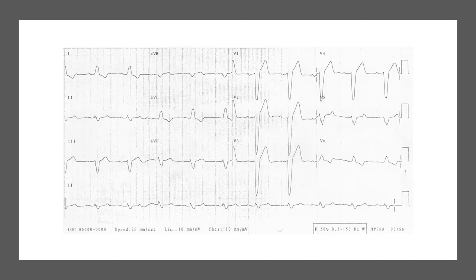Okay, and for those looking at this and seeing a bunch of ST elevation and being concerned that maybe this patient's having an infarction, this is a normal presentation, and I have a whole video dedicated to looking at aberrantly conducted complexes like left bundles and applying criteria to determine if the patient's having an acute MI. I highly recommend that for helping you to find STEMIs in these kinds of patients, because left bundle branch blocks especially can present with inherent ST elevation that is benign and normal for them, and does not mean that they're having an infarction. And you need to be able to tell the difference in these patients, because they're clearly at higher risk. If they have a left bundle, the probability that they have some sort of cardiac disease is much higher, and thus they're at much higher risk of having an acute infarction.